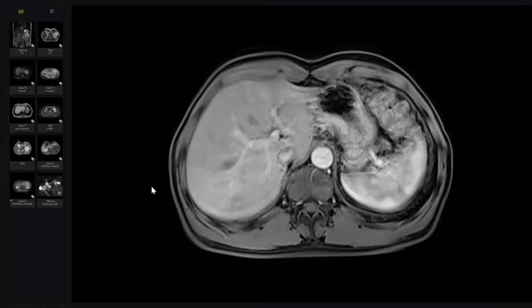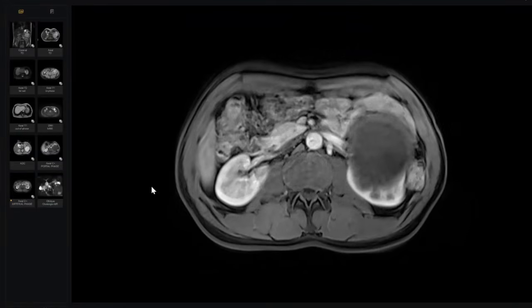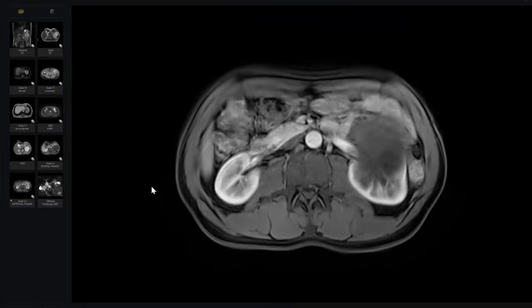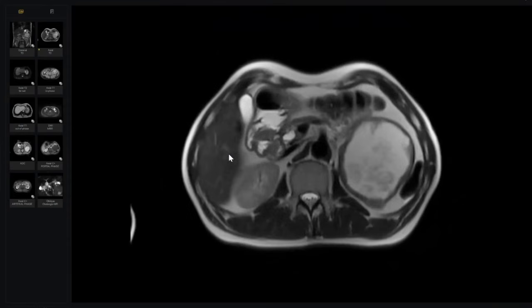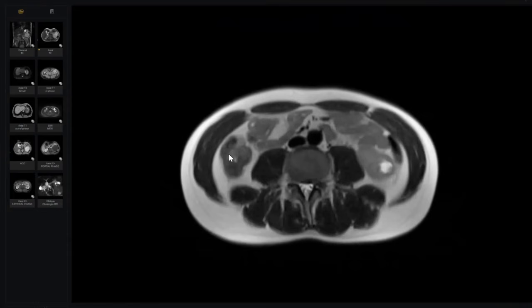What's your final diagnosis, doctor? This is a renal cell carcinoma, and in my routine practice, I would check the liver for any hypervascular metastasis and also the lungs to look for any metastatic lesions, and also I would check the bones. Yes, I think there is a nodule noted in the cyst as well, sir.